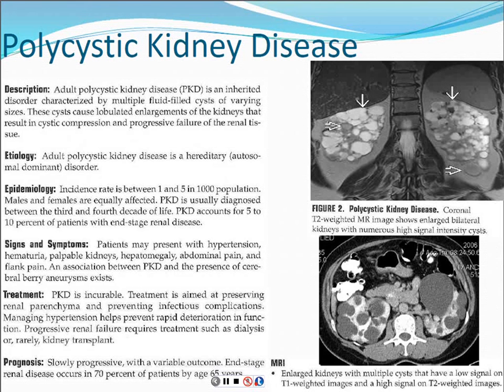The other thing you'll see along with these renal cysts, we've changed the name in recent times to calling it adult polycystic disease, because it doesn't always just affect the kidneys. You can often see those liver cysts like what I showed you earlier, those hepatic cysts, but you'll just see tons and tons of them like in the kidneys. So those can often go together. You can also see cysts in the pancreas frequently, but not as often as you see co-occurring hepatic cysts.